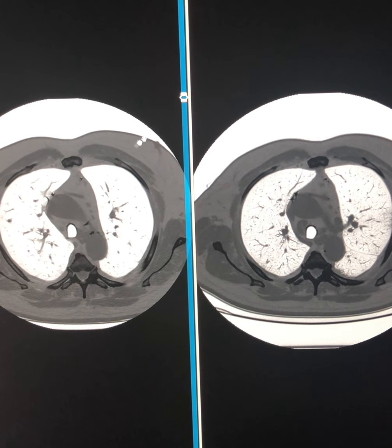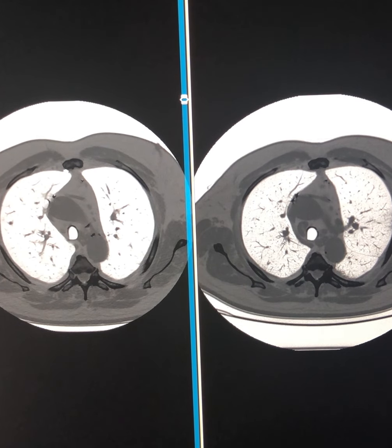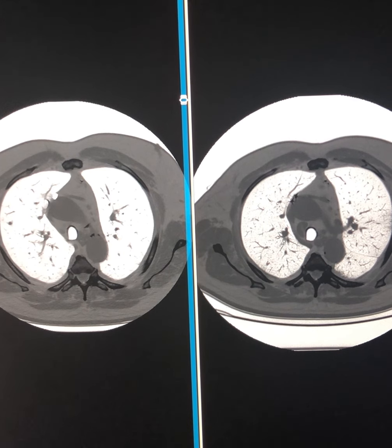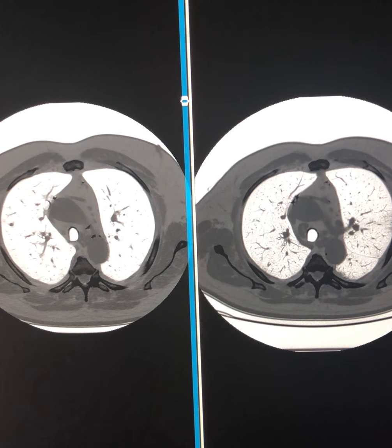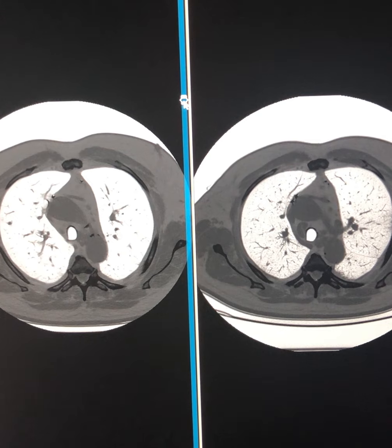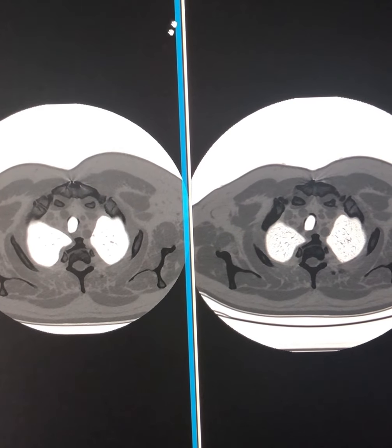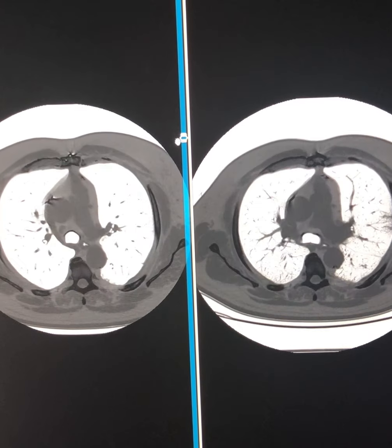The lung is quite a dynamic structure, unlike other solid organs, where it moves smoothly against the chest wall and other structures when the patient breathes in or out. The movement is more conspicuous at the bases when compared with the apices. So when we go to the top of the lung, this part of the lung moves much less than the bottom part of the lung.